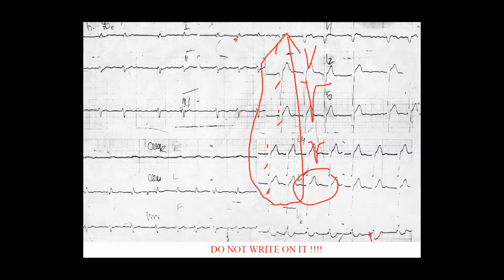If you do have a left bundle branch block, for sure you can expect a QS complex all the way. And in V6 or lead number 1, that's an ST depression. See, ST depression is not an elevation. If you had something like this in V6, that can be a STEMI as well, but here not.